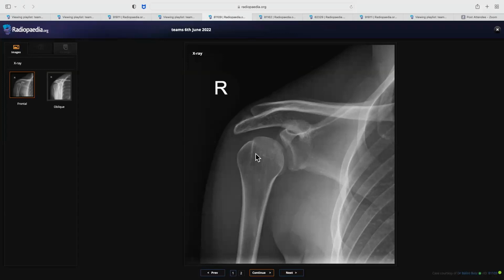you can suspect that. Because if you see everything else normal, even the lung is normal, the bones are normal, everything, then there is something to do with the joint. And you have to think about the joint. And patient had recent exertion, I told you. And you don't see any fracture, you don't see anything related to that trauma, then you have to think of dislocation. And dislocation, then you have to think about the articulation. If you know these signs, that will help you.